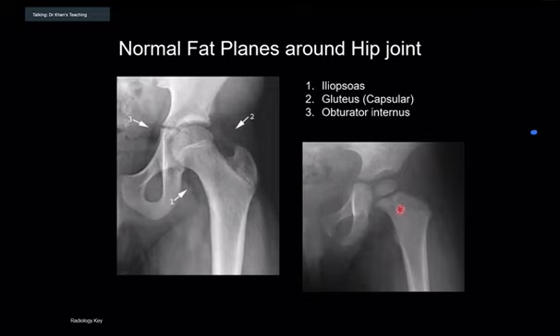And you have to develop your eyes. In the pediatric age group, this finding of the metaphysis has come in the exam many a times. So there is an infective process, and there might be some sclerosis or might not be any sclerosis. Distension of the fat planes should be something which should be your pertinent negatives or positives in the exam.